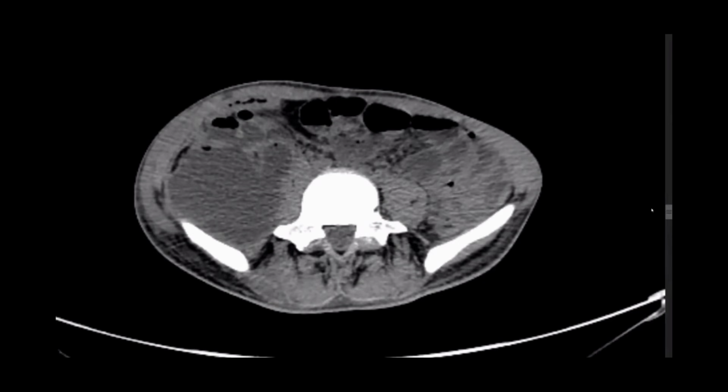So this cystic mass with internal air foci is likely suggestive of an abscess. It's an inflammatory abscess, an infective collection. Okay, once you have an abscess like this one, how can we get the cause for this abscess? What do you think are the causes for this abscess?